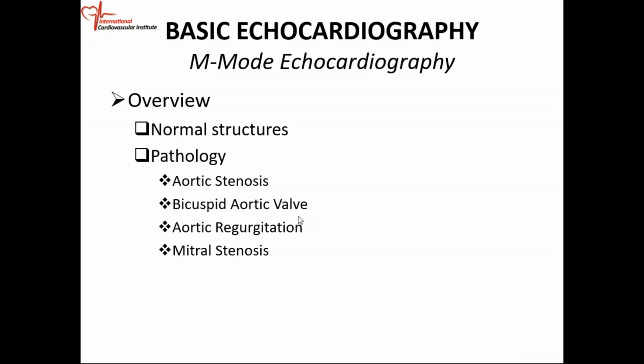So what we're going to do is look at basic M mode over the next few sessions, and then we can go on to a little bit more advanced M mode. So when we say M mode, we mean motion mode. It's the earlier form of echo.